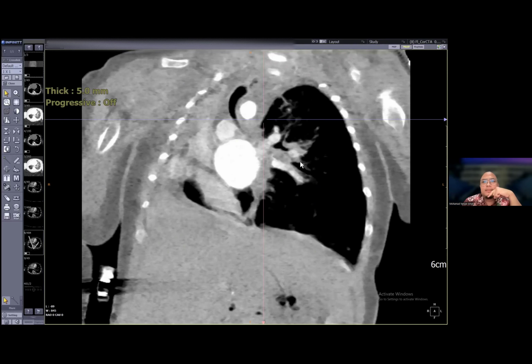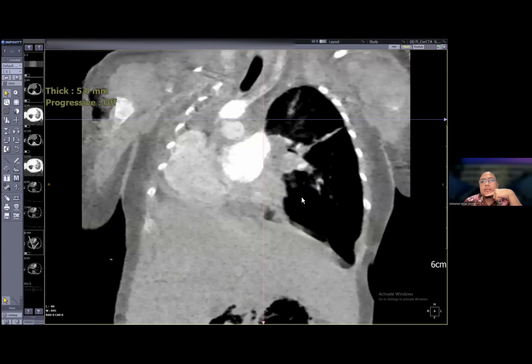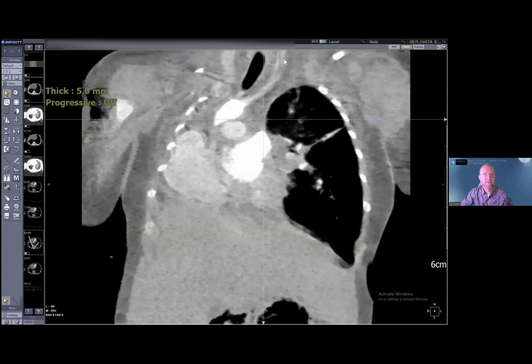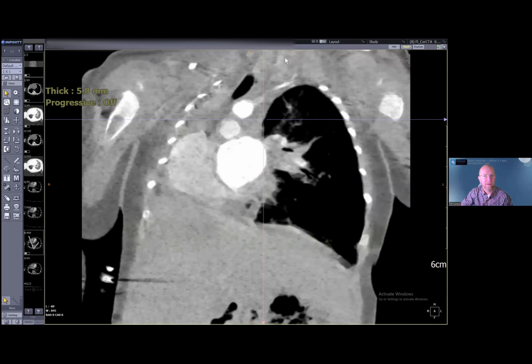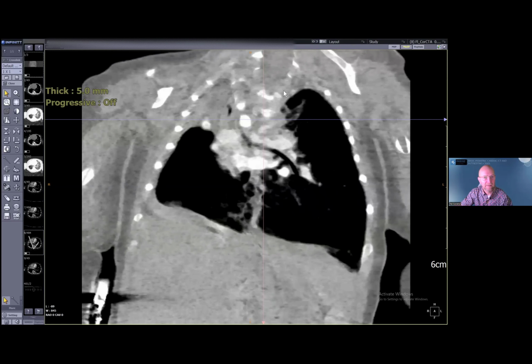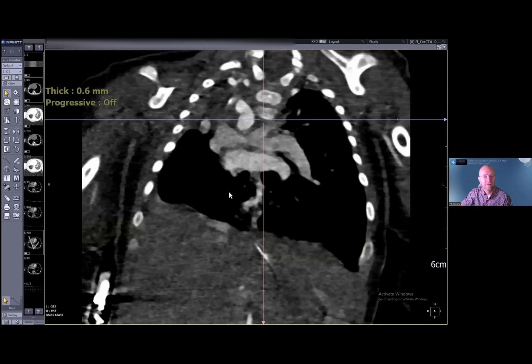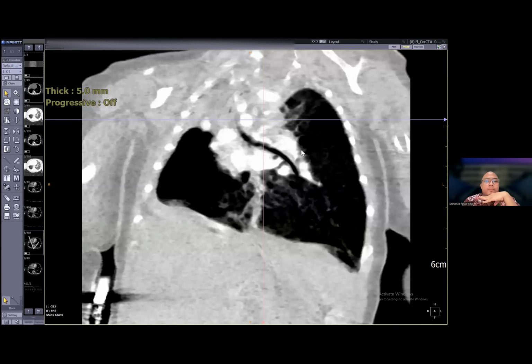Yes, that's true. So there almost seems to be no airway on the right side, but we have some aerated lung. So that's interesting on the right side. How does that lung get any air? It's from bridging. It's a bridging bronchus actually.